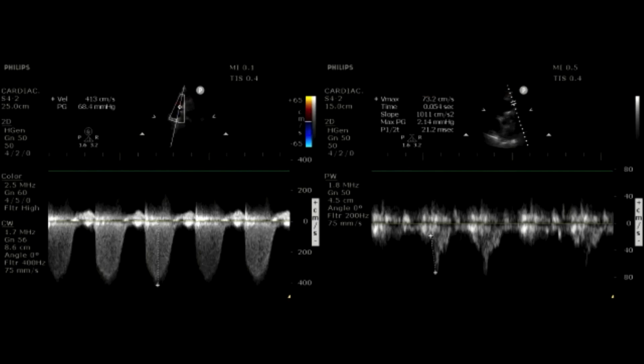How do we add Doppler to this assessment to really start seeing this physiology play out right in front of our eyes, not just have it be some theoretical thing that we understand is going on, but don't actually see. So measured the tricuspid regurg jet velocity and measured the pulmonary artery outflow, essentially the jet, but the acceleration time there.